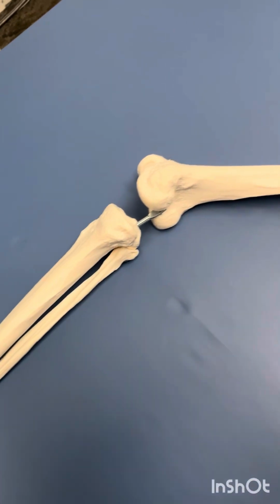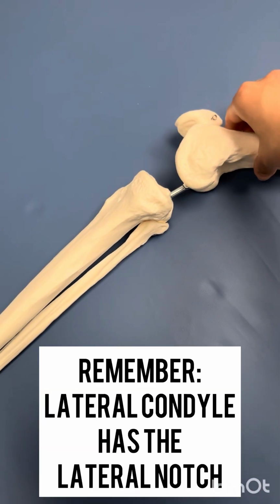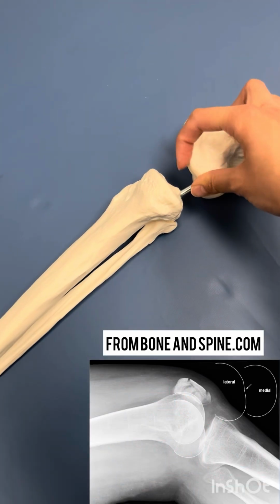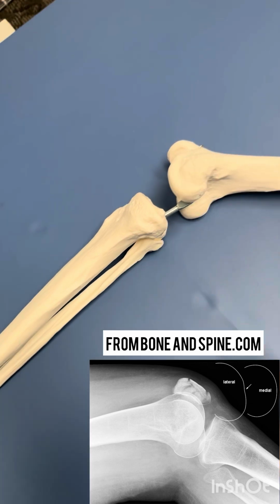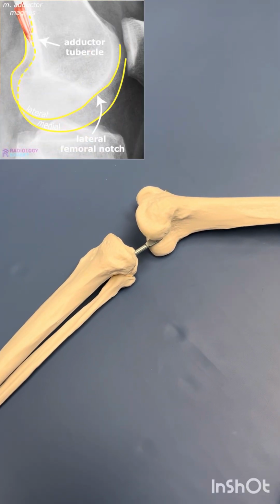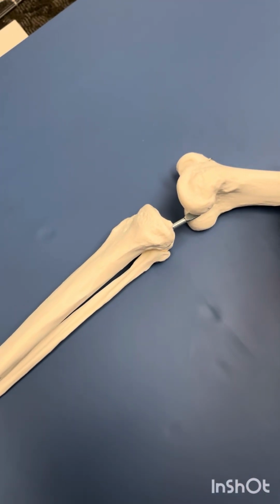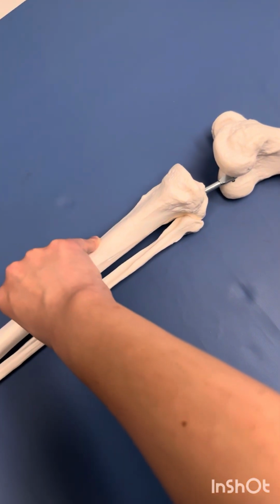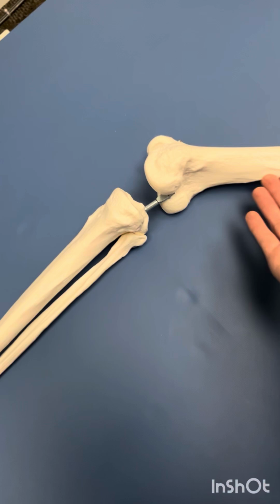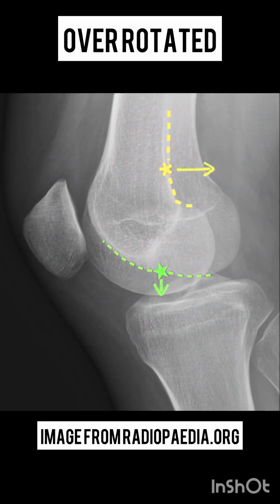And when you look at a picture of the x-ray, you can tell which one is the lateral condyle by whichever one has that lateral notch. And the medial condyle is usually more round. The lateral condyle is a little bit more flattened out because of that lateral notch. And if they have a really obvious lateral notch, you will see it for sure. So if it's over-rotated, the lateral part of your knee will be more posterior, which means that you need to rotate the knee more medially so that everything lines up.